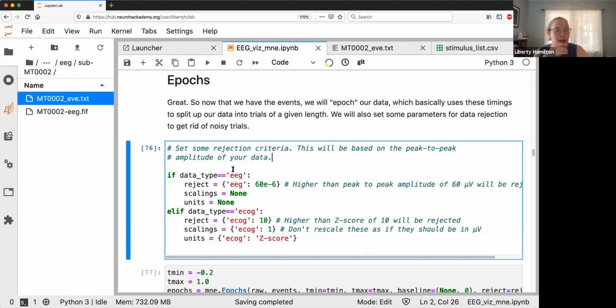So you could, let's see, response time limitations. You could have another file that's a list of reaction times or something like that. Like, this is how I'm imagining this context. And if the reaction time is too late for that trial, then you just remove it from your events list. So that would be a way to do that in Python.